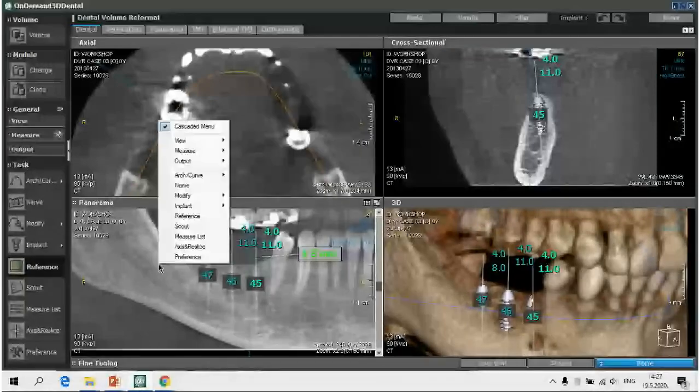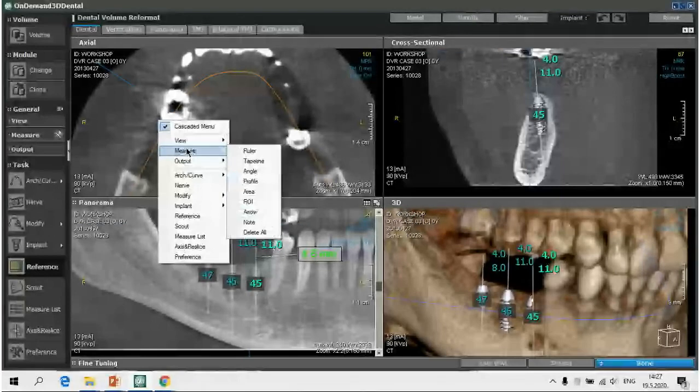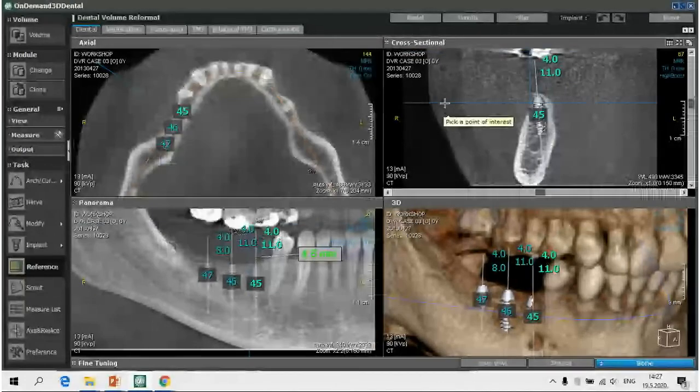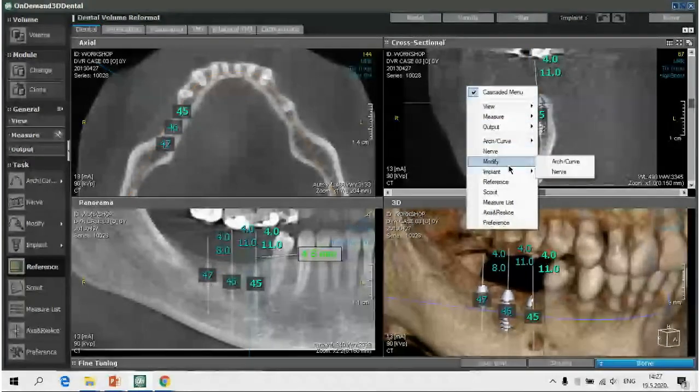Also, these tools, which are called the tasks, are all available on right click, and it could spare us a lot of mouse and cursor movements and speed up our actions a lot, because wherever we are on any part of our picture, we are able to activate the tools and use them much faster than if we go to the picture on the left side.